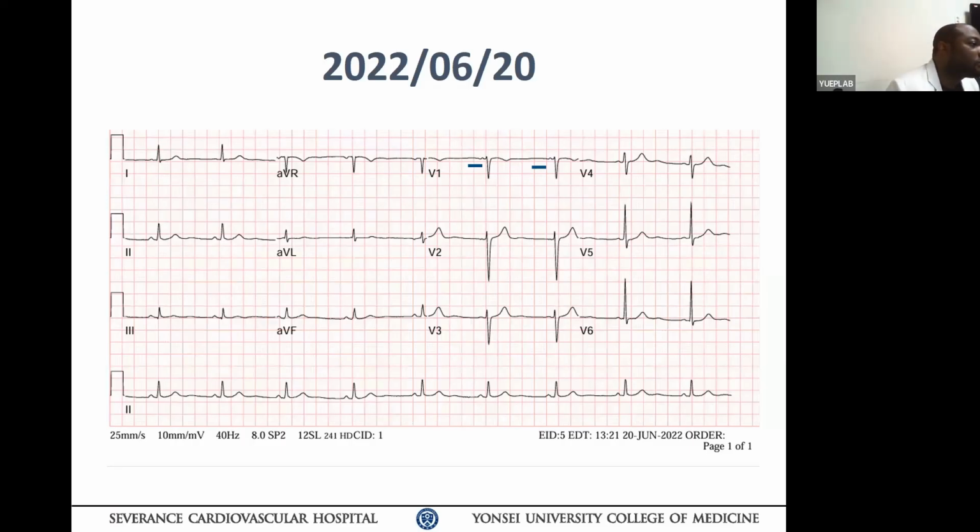The faster the rate, the shorter it is; the slower, the longer. Obviously, if a patient has underlying enhanced AV nodal conduction, for example what we used to call short AV nodal, your PR can be shorter. Okay. But other than that, what we have discussed.